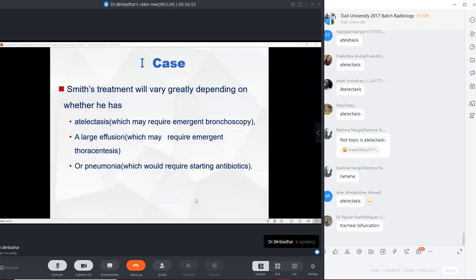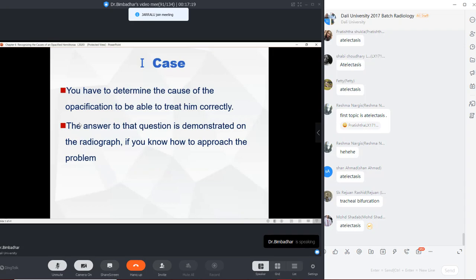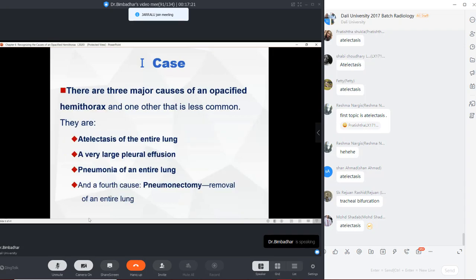Obviously, no. Where there was no pneumothorax, now I am getting air from the external environment into the thoracic cavity, causing him a pneumothorax, right? So, do not misdiagnose the situation. It is always very important for a radiologist to find out what exactly is the reason behind that opacity. Now, let us try to understand how we are able to do that.